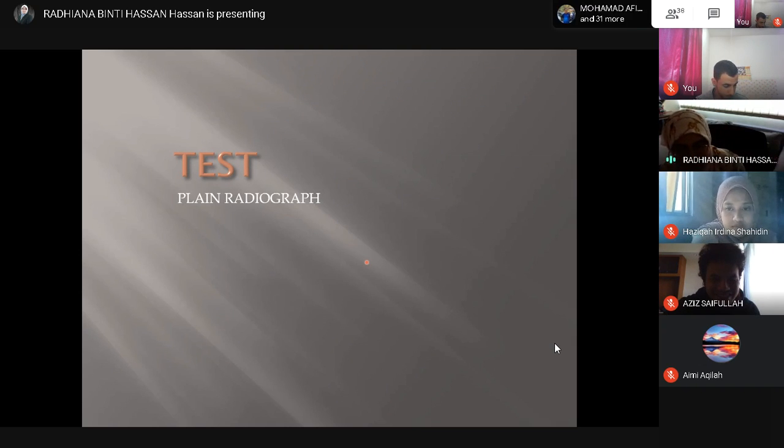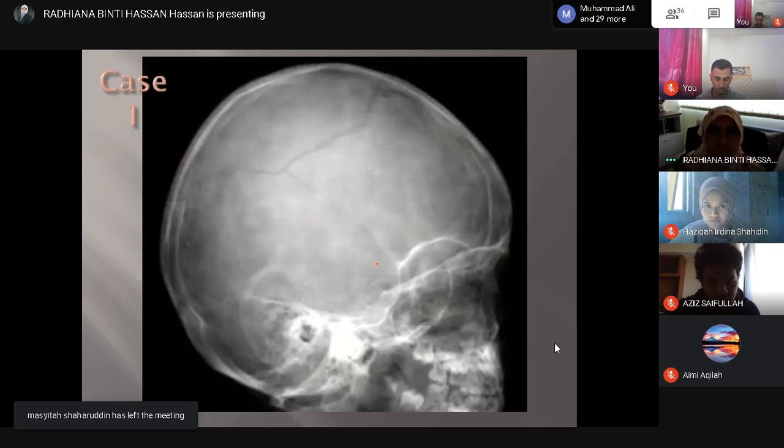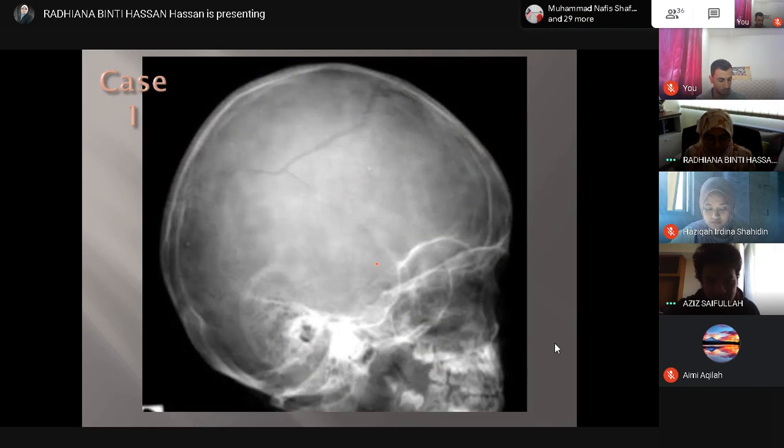Okay, so now let's see what you have understood so far. I'm going to show you a few images. You all tell me what are the findings, okay? Fracture. Name the examination, so you consider this as exam films. So you name me the examination, you describe your findings, you give your diagnosis, and if any, then you can give the differential diagnosis, okay?